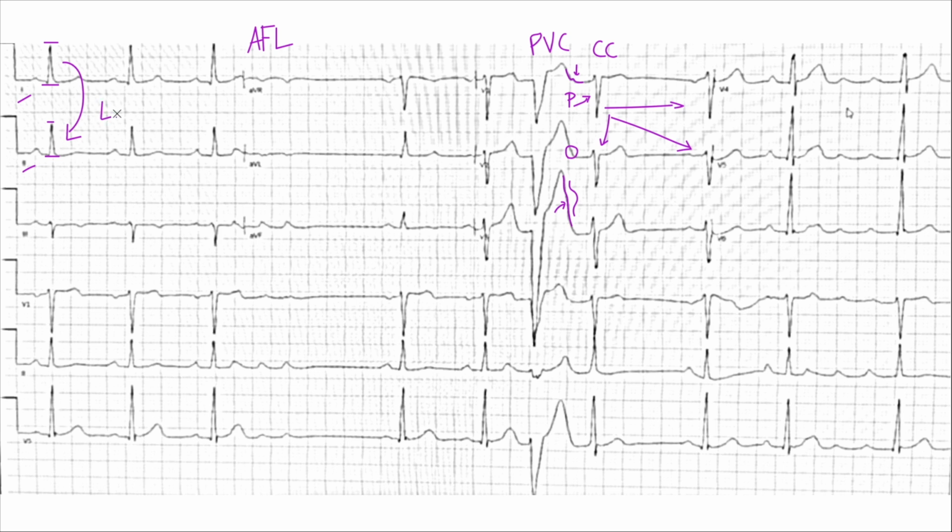This would be indicative of left arm and left leg leads being interchanged. Okay, so somebody slapped the left arm onto the left leg, and the left leg was slapped onto the left arm. All right, now this also confirms it.